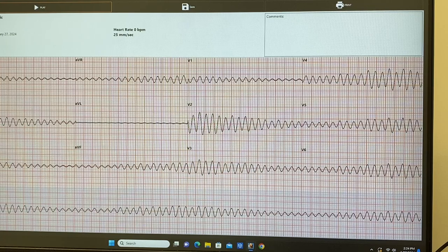It goes big, then small, kind of like those party streamers, they twist. So you want to associate that word with what we're going to categorize this as. Technically speaking, we call this a polymorphic VTach. Polymorphic because there are different sizes, big amplitude and small amplitude. Polymorphic VTach.